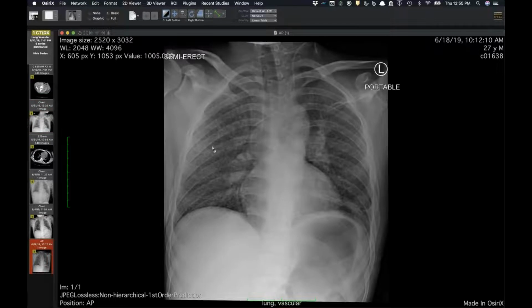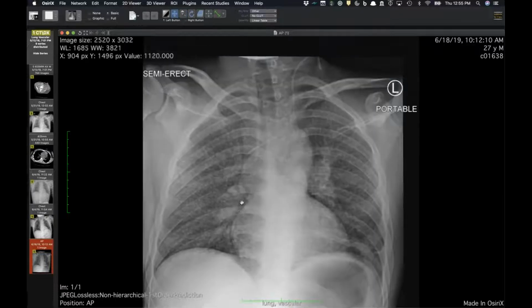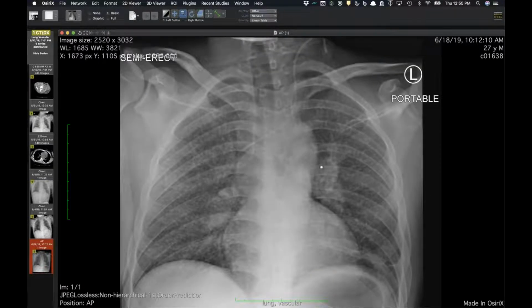This is a patient that came to us and had this radiograph. There are a couple of findings. He's 27. He has a left internal jugular central venous catheter. And you can see he's just got very busy lungs that look nodular. His pulmonary arteries may be a little big on here, but everything else was done outside. The history was he was transferred to the ortho service here because of septic joint of some sort.